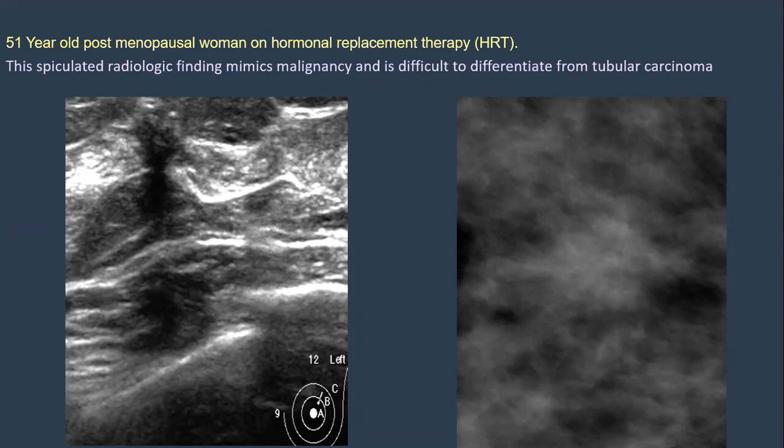From the list we mentioned before regarding the etiology of architectural distortions, what do you expect, benign or malignant? Malignant, from the ultrasound and mammographic features. Okay, so you are going to suspect invasive ductal, invasive lobular, mixed, or DCIS. You are not considering the benign findings at all? It can be benign.